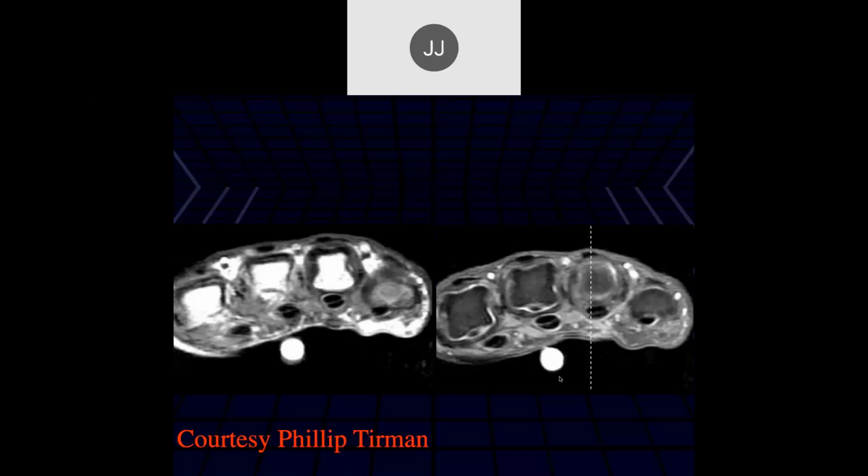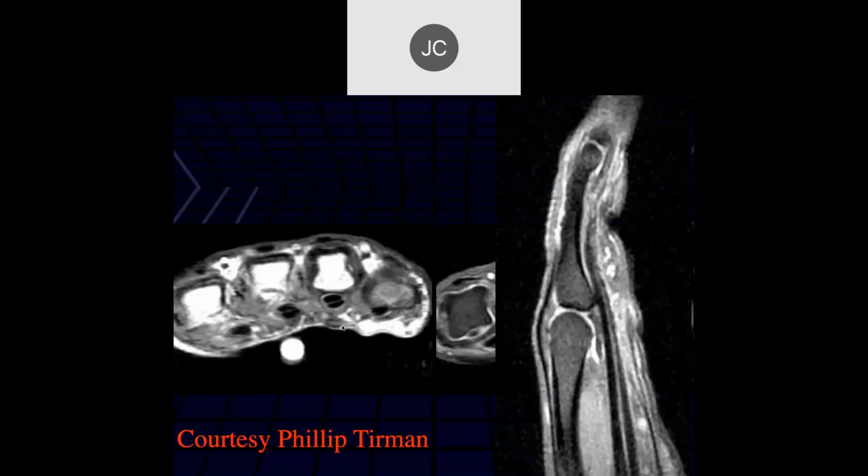Okay, so marker volar aspect to that second digit. See some mild tenosynovitis surrounding the flexor. You can see kind of odd, kind of increased fibrous tissue in between the tendons here as opposed to over here. If we go to the sagittal images, this is fat suppressed.